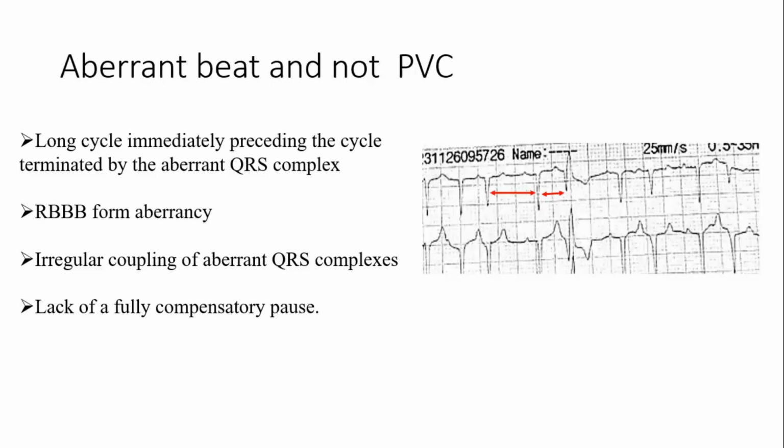So these are the features that will help you in differentiating. There are a lot of others as well, but just remember 2 to 3 of these. Otherwise, any long-short sequence, just write Ashman. This is most likely the answer. But just for your knowledge, remember these points. We'll probably move to the next case.